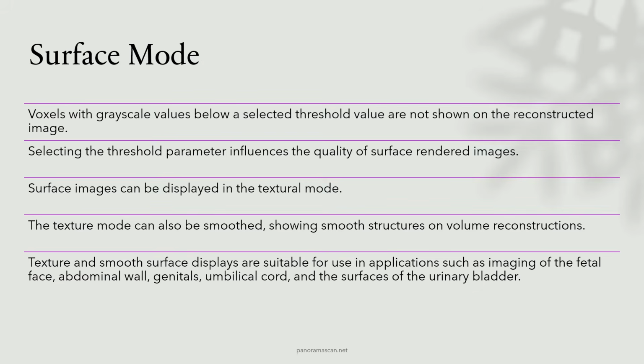The textural and smooth surface displays are particularly effective for imaging fetal facial features, the abdominal wall, genitals, the umbilical cord, and urinary bladder surfaces. These displays enhance the clarity of the external anatomy, enabling clinicians to assess for surface anomalies such as cleft lip, spina bifida, or other developmental concerns.